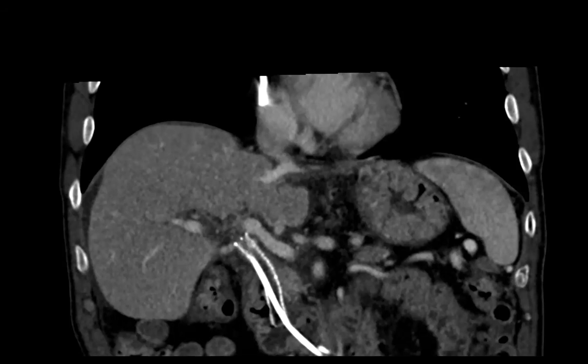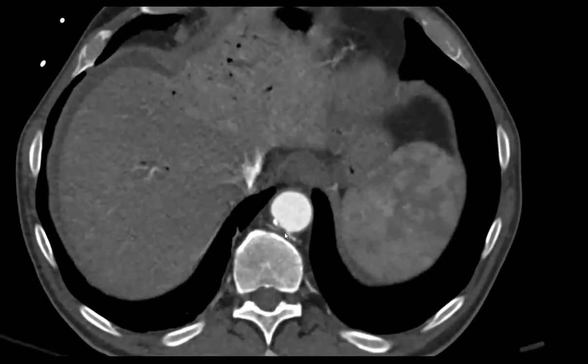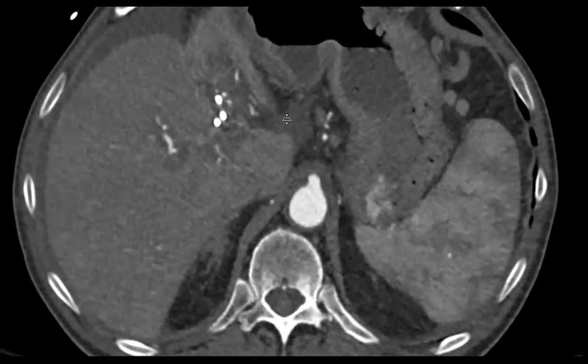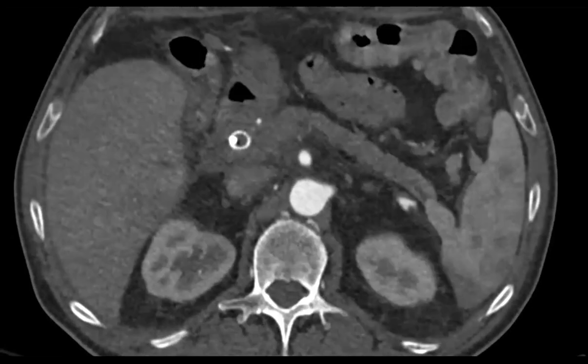Can you show the arterial? I feel like that would be easy to miss on the axial or in general, because those stents... We did not scrutinize, actually call it prospectively. We just said it is very close to the hepatic artery, but we didn't call it pseudoaneurysm because we weren't sure what was going on. But then IR went in and embolized, and they said there's a pseudoaneurysm there.